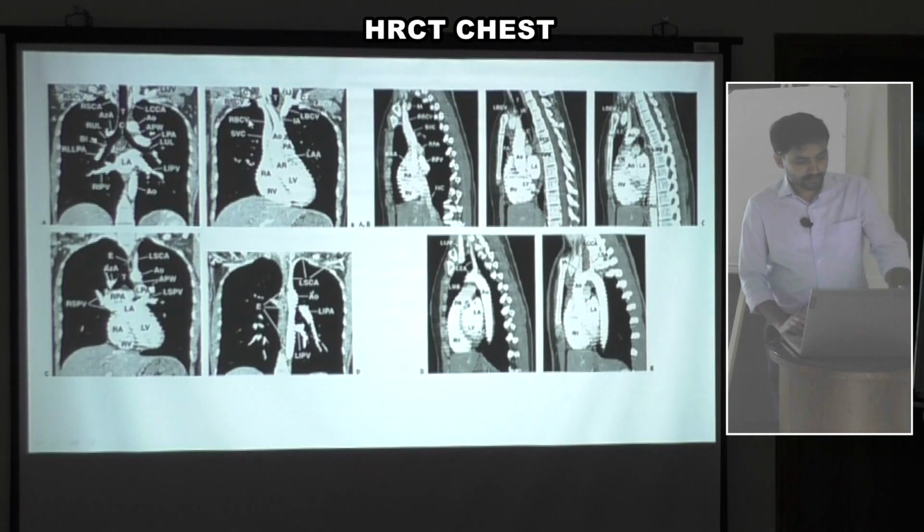So this is the coronal section, again showing the same structures like the aorta and these three vessels of the arch of the aorta. This is the trachea, which divides into the right main and left main bronchus. These are the sagittal sections. This is the arch of aorta and descending aorta. So this is coronal, and these are the sagittal planes. So this is normal basic anatomy and basic windows, mediastinal window, lung window, and the normal anatomical structures.